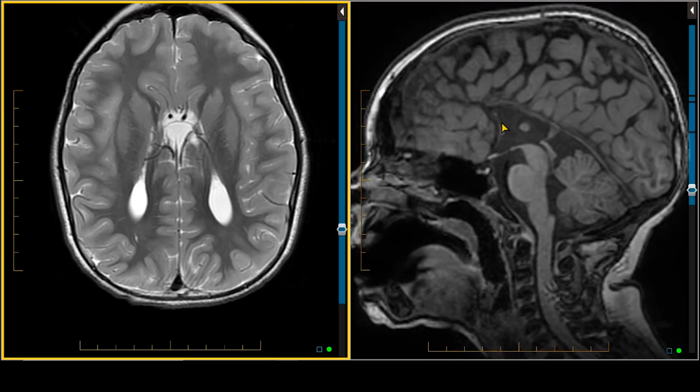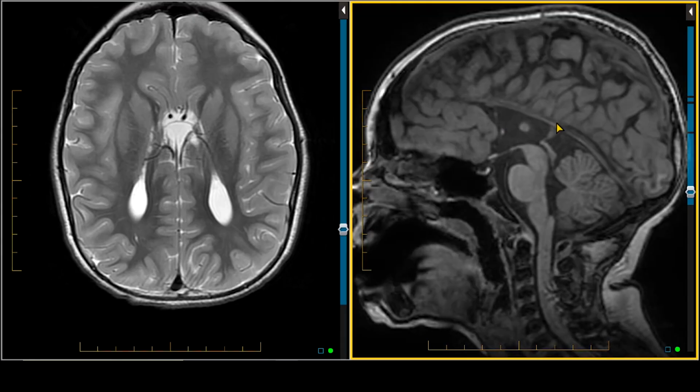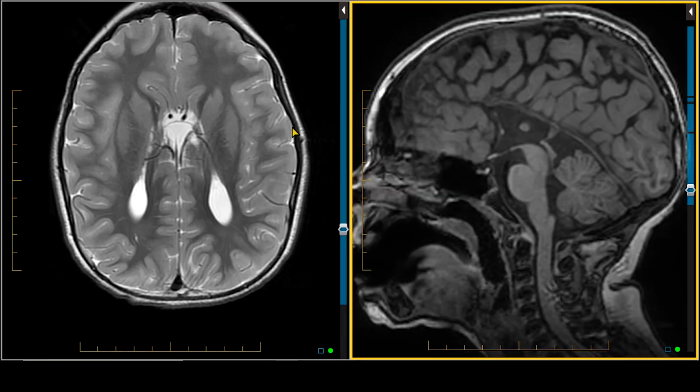As we go up, we're seeing no intervening corpus callosum. If we go to the sagittal T1-weighted image, for the midline structures, we do not see any aspect of the corpus callosum. Additionally, normally just above the corpus callosum is the cingulate gyrus, which runs anterior and posteriorly. Here, we do not see that. We see these radiating gyri that come all the way down to the third ventricle here. We also see, here's the anterior commissure, which is a little on the small side, but otherwise we're not seeing any commissural fibers of the corpus callosum.